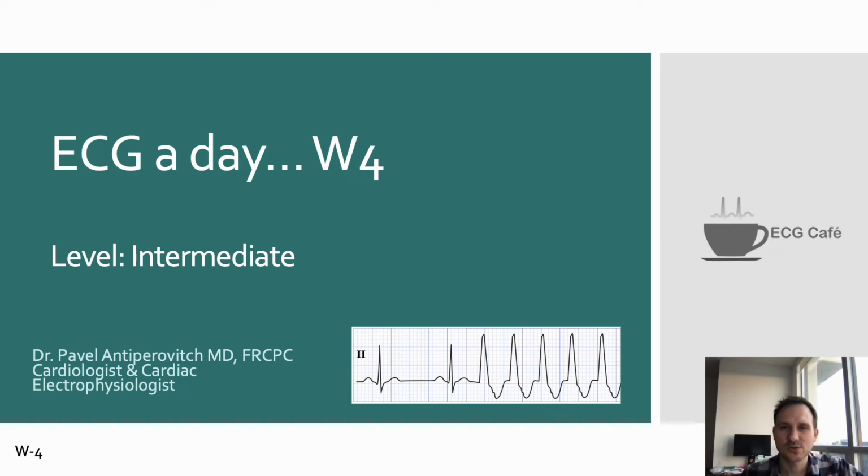In this particular video we're going to go through a series of tracings from the same patient. I thought they're all excellent at demonstrating learning points, so I kept them all, and I hope you enjoy them and learn a lot from them. So having said that, let's get started.